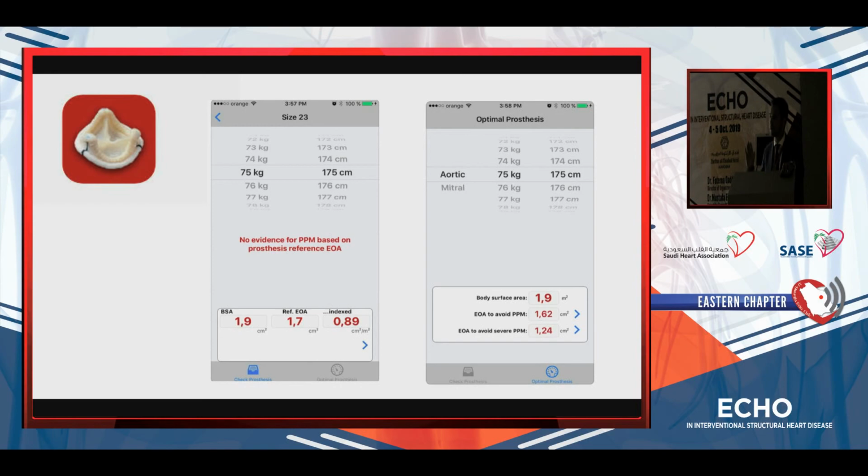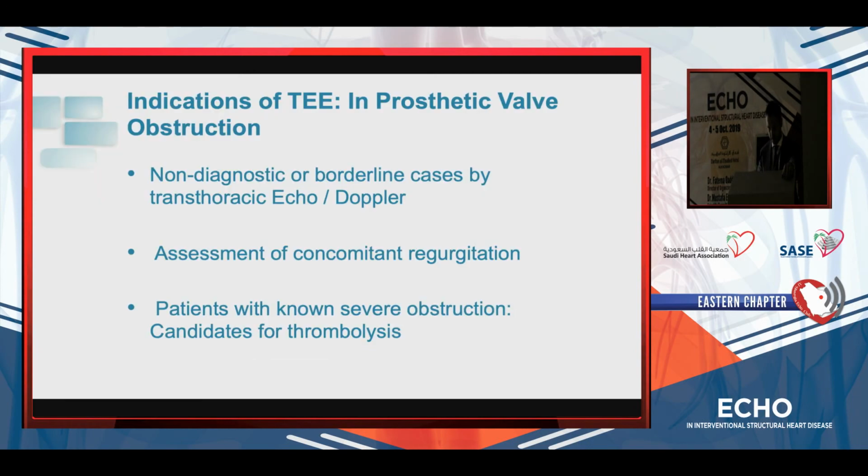So you just fill in the measurements and it will tell you according to the flow chart if we are going to have a high flow state or an obstructive valve. And when you're in doubt, we really need to do a TEE in these prostheses. So if you have non-diagnostic imaging, if you want to assess if there is a concomitant regurgitation, and when you're in doubt if there is an obstruction and maybe a patient who is a candidate for thrombolysis.